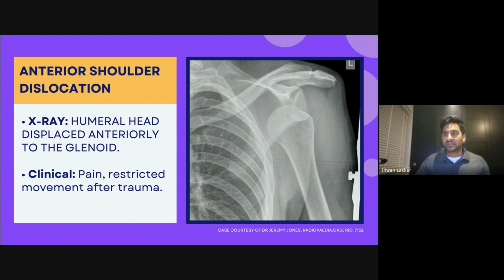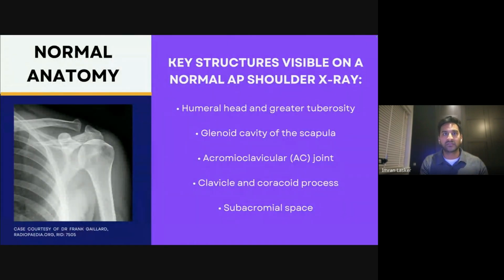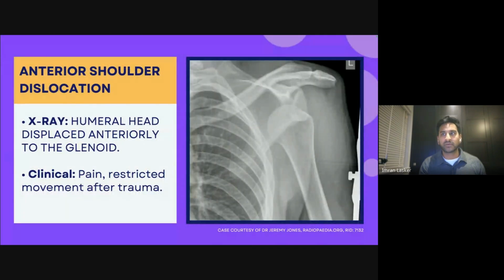So this has given the answer, but what I also will do is try and encourage you to have a bank of normal, right? And if you're ever unsure, go to Google, type in normal looking shoulder, and then compare it to the person that you've got in front of you, right? So obviously you've got your experience of seeing the patient in front of you.